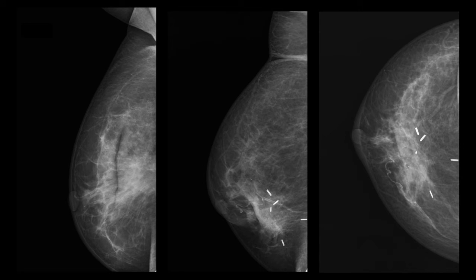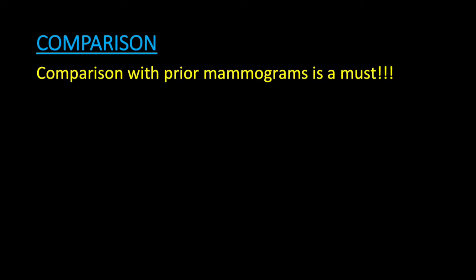So these are a few images of post-operative breasts. This is the scar from the surgery. This dense area around the scar is actually a collection beneath the scar. This is a breast surgery done some time back. There's a scar tissue, the skin has retracted there, and this is probably the area where the lumpectomy was done. Here you see the clips in the area of lumpectomy.